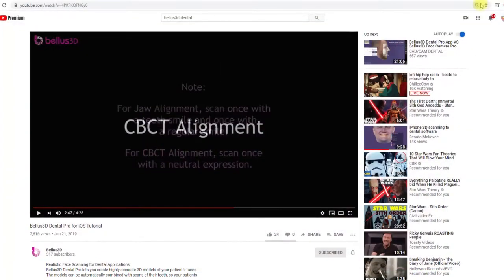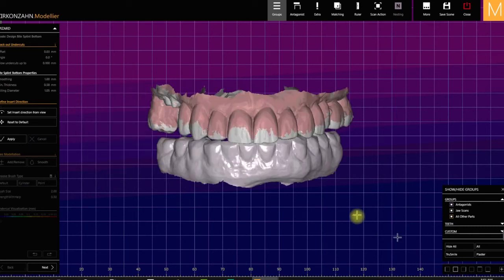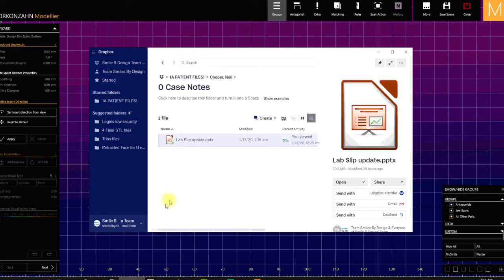That was a good little video. All the scans are in there in the Dropbox now. So let's go to the computer. Here's our original modeller. It's not quite ready to bring in. We got a little bit of work in the Dropbox to do. So let me go to the Dropbox, and this is just the one little tricky thing with the zip files.